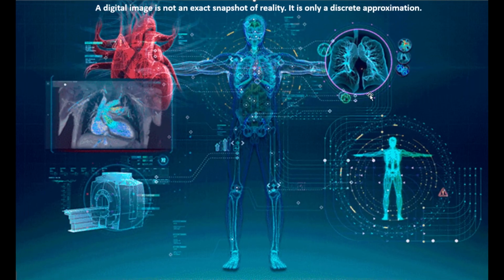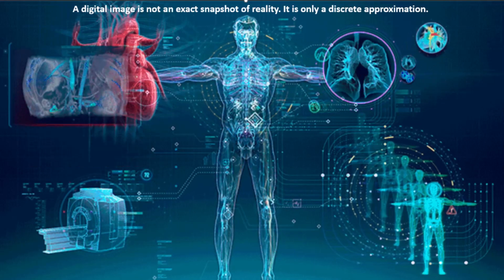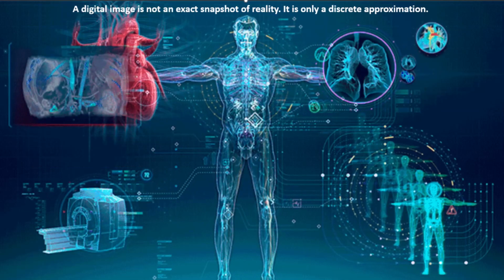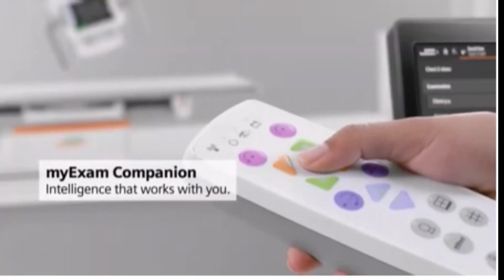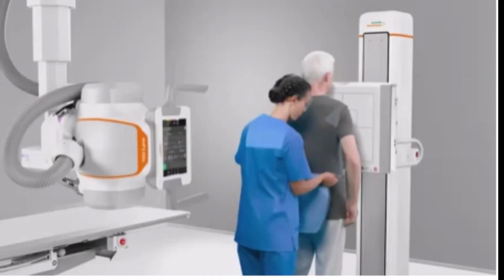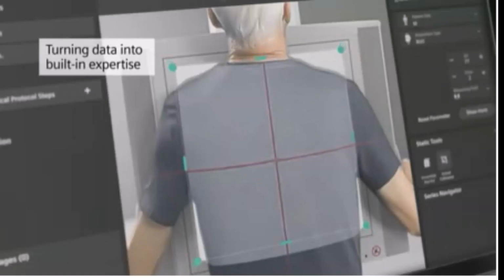A digital image is not an exact snapshot of reality. It's only a discrete approximation. After capturing the original digital imaging, we can post-process the image to find more information if need be. This allows us to display the information we've captured in many ways. So let's take a few moments to look at the process of image capture, image manipulation, and image display.